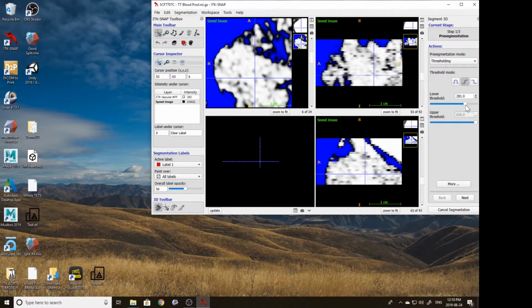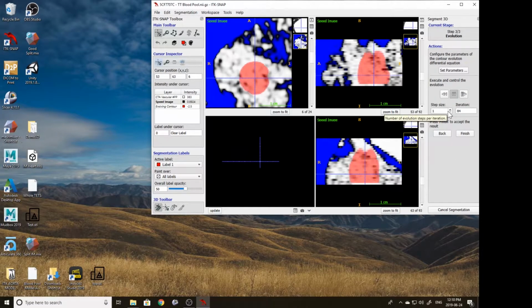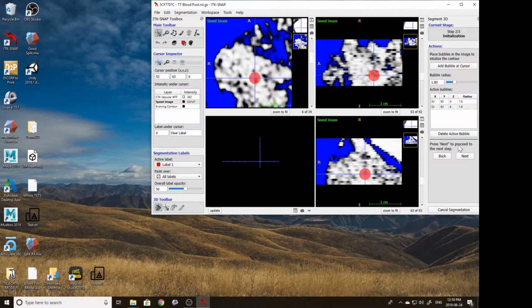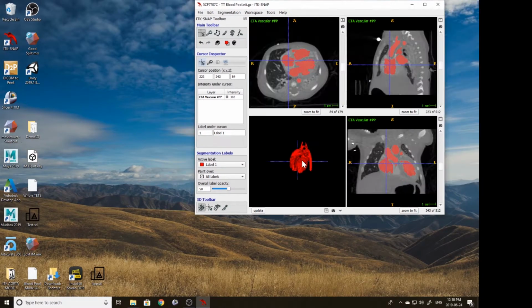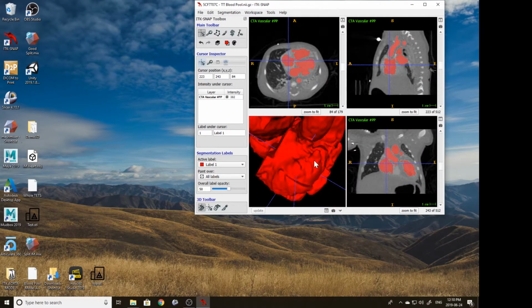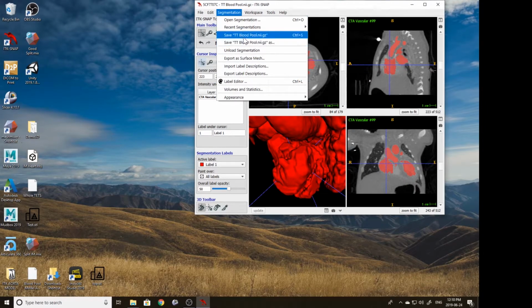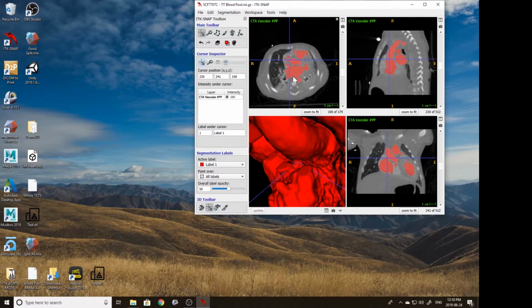So as you can see in the bottom right, there was a little bit where it was crossing over a septum. Oh, and see it bled over, so that means I'm going to have to lower that thresholding just a little bit. I try to do that as little as possible, that way I still get some good resolution. See there where it branched over into the aorta. I was able to pause it in time so it didn't do too much, but we can go in then and find it and just do a little bit of erasing.